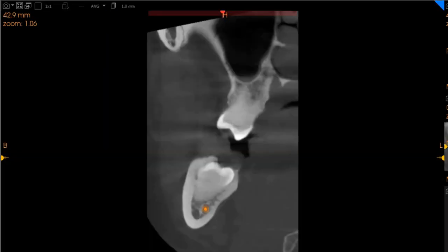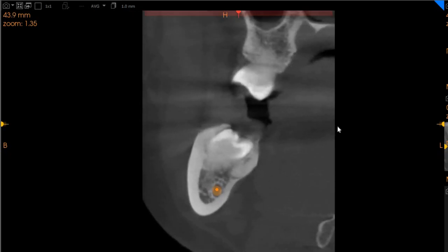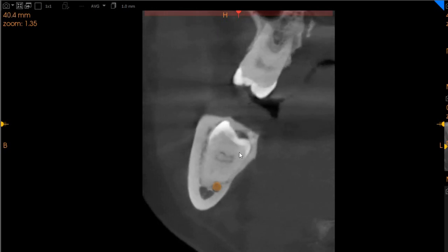This is the transaxial view, which is basically the proximal view. And here you can very clearly see this is the mesial aspect of the wisdom tooth. This is the mid root level. The wisdom tooth is associated or ankylosed with the bones, so we don't see any major PDL space here. It is right on top of the inferior nerve marked with orange right here.